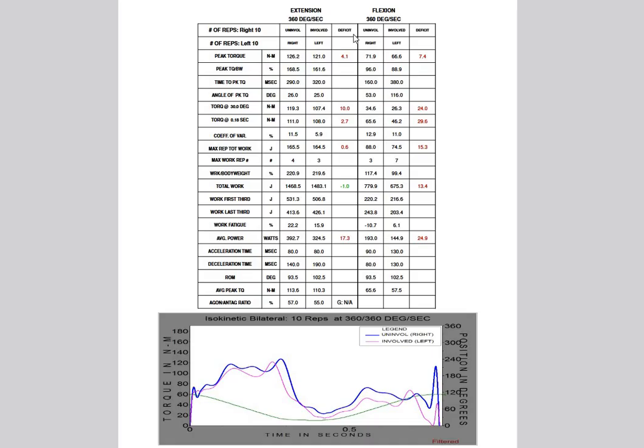As you can see by the deficit values here, most of them, with the exception of a couple here in knee extension and a couple in knee flexion, there isn't really a huge amount to talk about. So there are some talking points. There's enough for us to discuss to get something meaningful from for the purpose of this video, but I wouldn't talk about this particular page of this report in any great detail. But let's begin by orientating ourselves to the page.